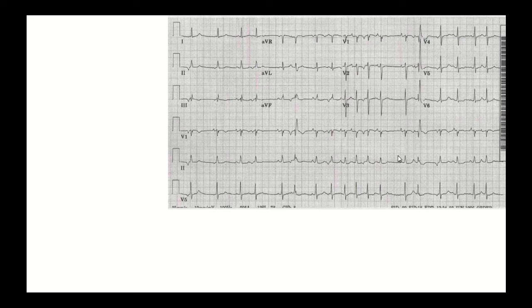It can look like AFib. It does not increase stroke risk like AFib, as best as we can tell, because it is probably still organized enough in its atrial activity that it squeezes to empty the atria and does not subject that blood to stasis that would then clot. This is associated with lung disease, but does not have to have lung disease in order for this to occur.